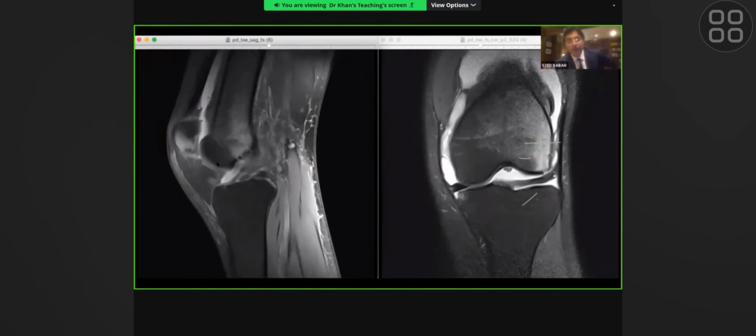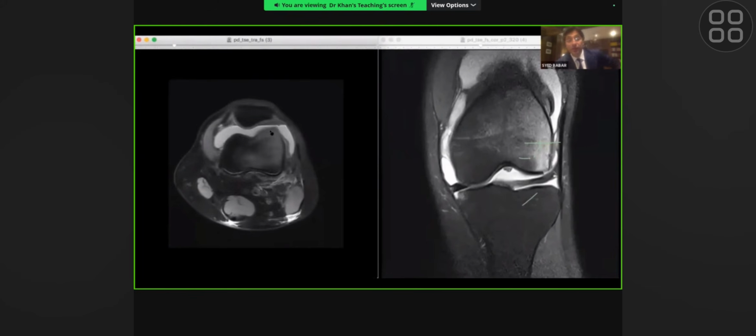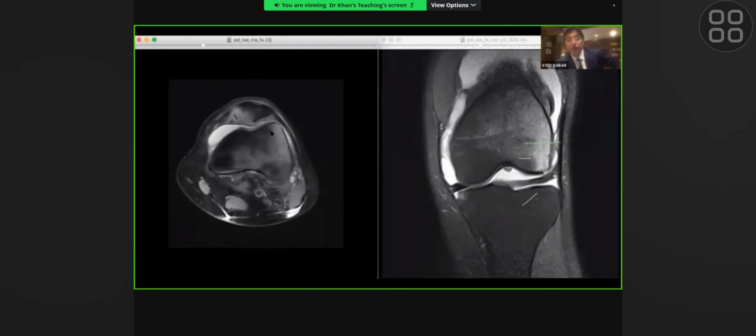So we've confirmed that the menisci generally look okay, the cruciates generally look okay, the patella doesn't look right, and the lateral femoral condyle doesn't look right. We need to see the axial sequence now to see what's going on. Bring up the axial sequence, and that confirms your fat fluid level, lipohemarthrosis, and here goes your transient lateral patellar dislocation. So this patella has actually gone, hit it here, come back, fractured the medial half of the patella.